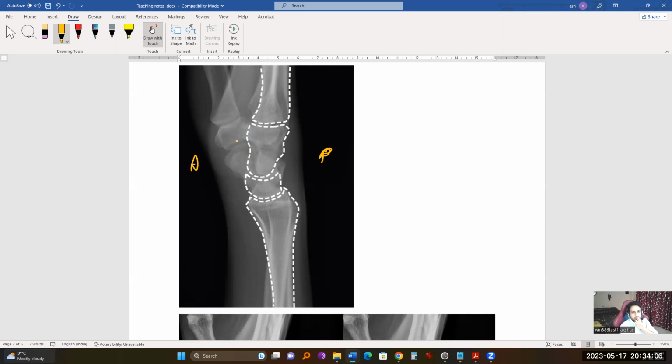So here you're again seeing two large bones. This is the trapezium, and this large bone is the scaphoid. And there's another bone within the scaphoid you're seeing. That is the pisiform bone. This is the capitate, and this is the lunate. And coming down, a few more bones.